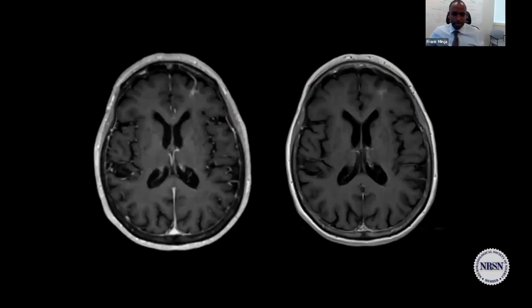So what do they look like? This will be the classic. If you look at the frontal lobe, the cerebellum, the occipital lobe, the parenchyma, you're going to see the stellate appearance of veins that converge into one dominant vein. And that dominant vein typically goes back up to the superior sagittal sinus, or sometimes it'll go back into the ependymal veins and so forth. So again, remember, these are normal veins. They're draining normal brain tissue. They're just all converging into one dominant vein.